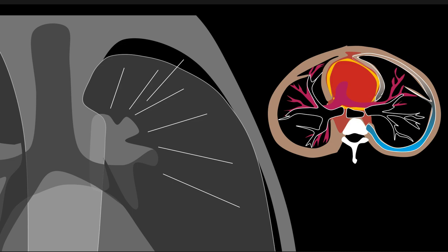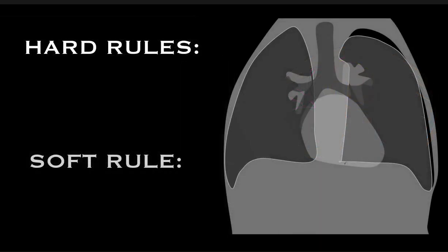If you see it and it curves at the lung apex like a pneumothorax is supposed to, if it's got that white line and looks just like it's supposed to, and the patient's pretest probability is not zero, in other words they're somebody that could have this and it's fitting clinically, you should not say, no way, it's got lung markings. That's a mistake. Don't do that. And we'll talk about how you can prove it later in the lecture.